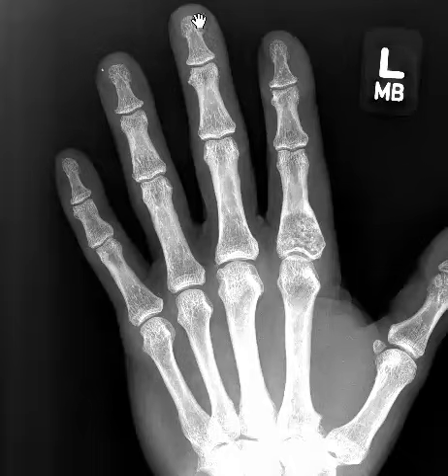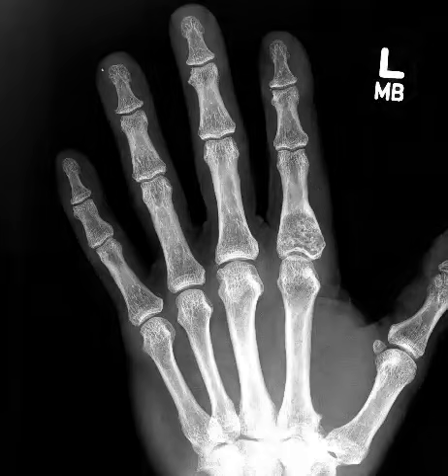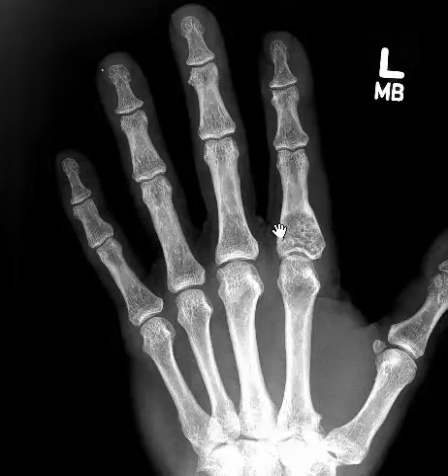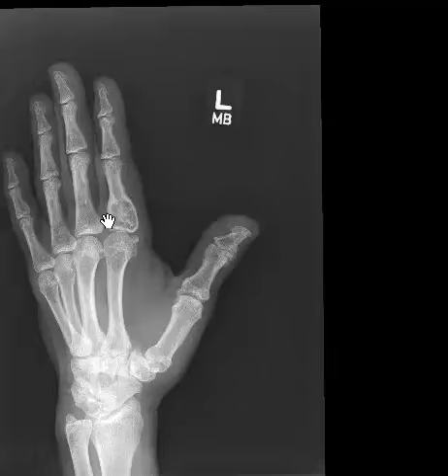This is a 72-year-old patient who had a soft tissue mass in their finger, their distal third finger right here. On the x-ray we do not see any bone destruction or erosion, and we do see a lytic process here in the base of the proximal phalanx of the index finger. They did have a little bit of pain. They thought maybe related to this, and on the x-rays here we see that the lesion is expansile. There's no cortical breakthrough, no bone destruction.